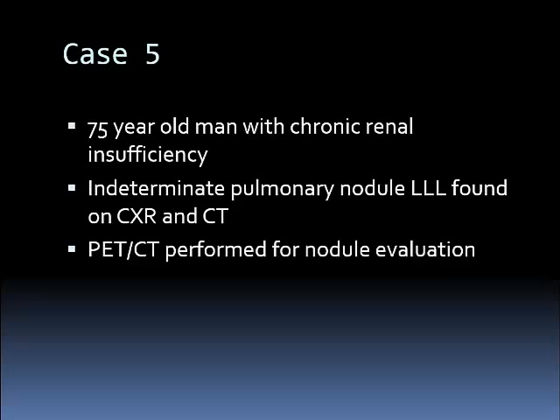Next case is a 75-year-old man with chronic renal insufficiency, has an indeterminate pulmonary nodule in the left lower lobe found on chest x-ray and subsequently confirmed with CT scanning, and PET-CT was performed for nodule evaluation.